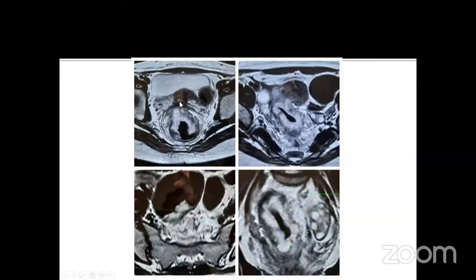The last image is a bulky tumor of the proximal rectum. You could see that the MRF is anteriorly invaded. It is actually the anterior peritoneal reflection. If you look carefully, not just the MRF, this is a female patient. There is the ovary on the right side. It is the fundus of the uterus.